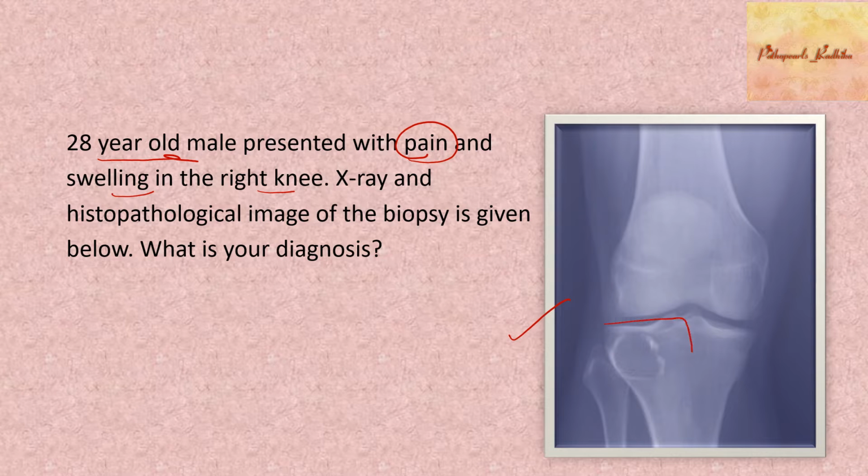See, you have a lesion over here. Okay, it has got a margin. It's a well circumscribed lesion. Is it radio-opaque or radiolucent? See here, it's a radiolucent lesion. And when you see the periphery of the lesion, you have sclerosis. Okay, so it's a benign looking lesion.